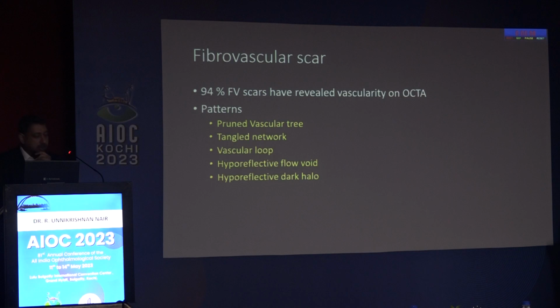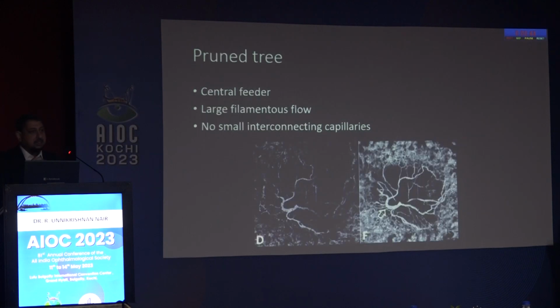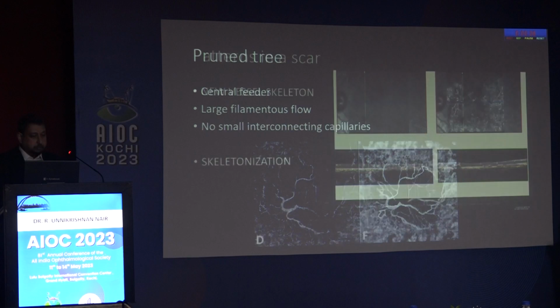The last part of the talk, I'm limiting to AMD, is identifying scars. So in a scar, what we said about the fibrillary nature, dead tree, there's a tree with no branches. This is the appearance of that. And this tells you whatever we talked before, there are no small branches, there's no peripheral lesions, it's just like a dead tree.